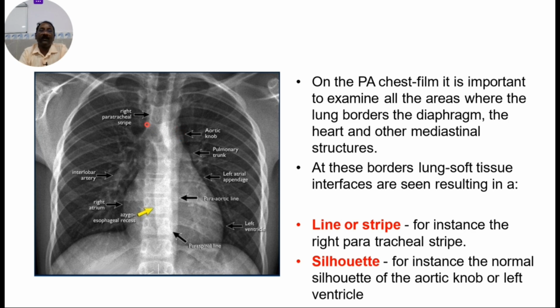In the one field, you appreciate here is the anterior mediastinal mass. Okay. So this is the pulmonary trunk. You can appreciate in chronic rheumatic heart disease, where there will be pulmonary arterial hypertension, this will be very, very filled. So the left atrial appendage, I already showed you left atrium enlargement. So instead of this concavity or the straight line, you will have the convexity. Convex border of the left heart border because of the massive enlargement of the left atrium.